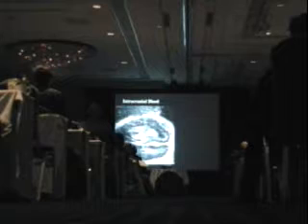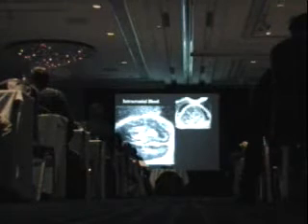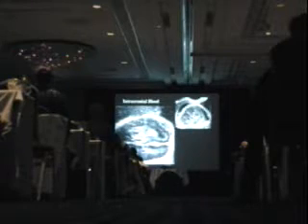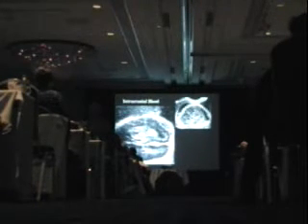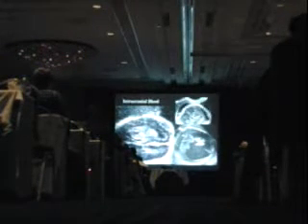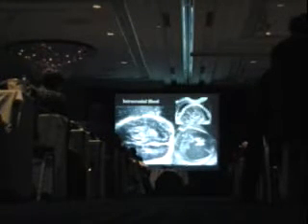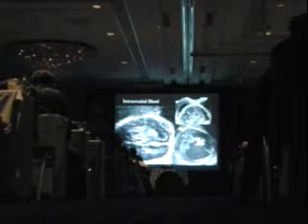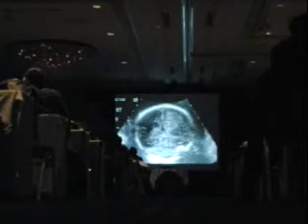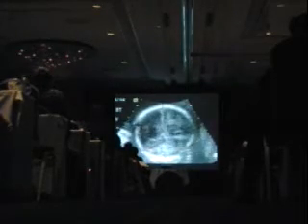So let's look at some examples here. This is an intracranial bleed. The fresh bleeds tend to be very echogenic like that. As they start to organize, you see some more cystic portions of the bleed with low-level echo, sort of like one of the endometriomas that Dr. Lang showed you a minute ago. And as you go further, you see that appearance of low-level echoes in sort of non-clotted blood in this very dilated ventricle now where there's been a huge bleed. And here is a clip showing you that acute bleed in this fetus.